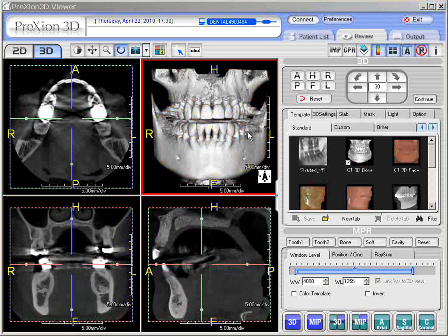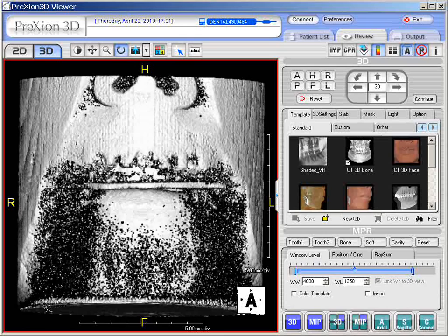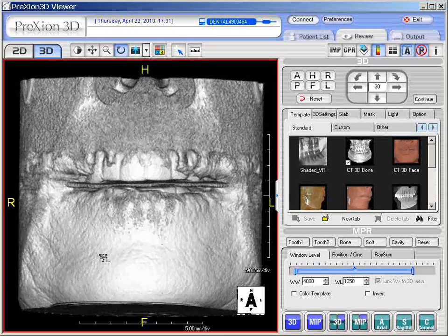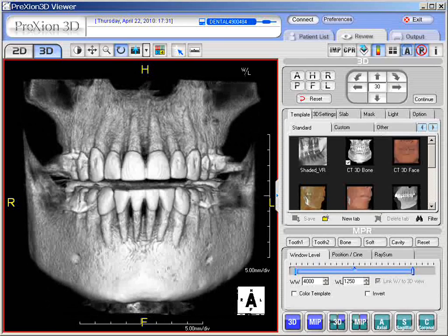Another feature of the mouse is the window level. Again, if we launch to a single screen, by holding the right and the left click of the mouse together, you can see here in the corner in the black background a symbol W over L, meaning window level. If you hold simultaneously and move to either corner, whether it's the lower southwest corner for full tissue mode, or if you move up to the right hand corner where you gradually take away soft tissue and just leave the bony elements.